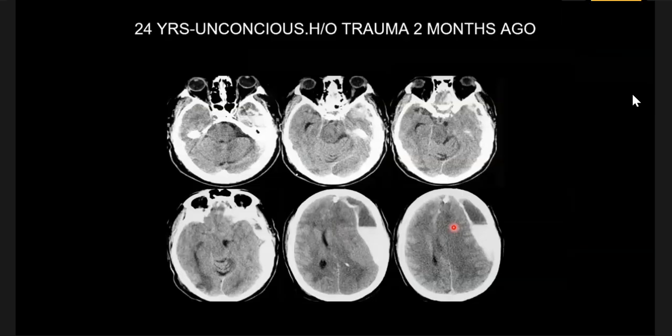Yeah, so there is an acute on chronic left subdural hemorrhage with associated mass effect, effacement of the ipsilateral sulci, effacement of the ipsilateral lateral ventricle, associated dilatation of the right lateral ventricle. There is also evidence of transtentorial herniation and uncal herniation with effacement of the suprasellar cistern, mild compression of the midbrain with increase in the cerebellopontine widening on the ipsilateral side. So, in keeping, this is acute on chronic left subdural with mass effect and associated subfalcine and transtentorial herniation.